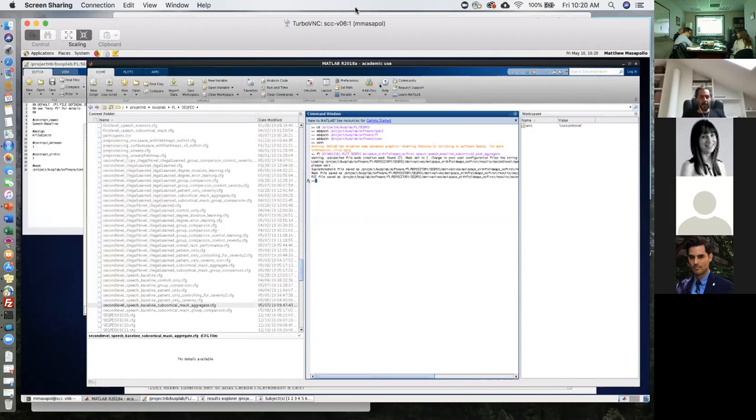So if a subject in the region that we care about of the brain was considered to be outside of the brain, now for the second level analysis it is assumed to have basically a zero value of the effect size for that subject. So that reduces the chance of finding any significant effect for that voxel, but it doesn't totally kill it as the implicit masking used to do. So in short, the results should be relatively similar, but you should see a little bit larger regions than what you were seeing before, regions that get a little bit more into the cortex and the borders of the cerebellum.